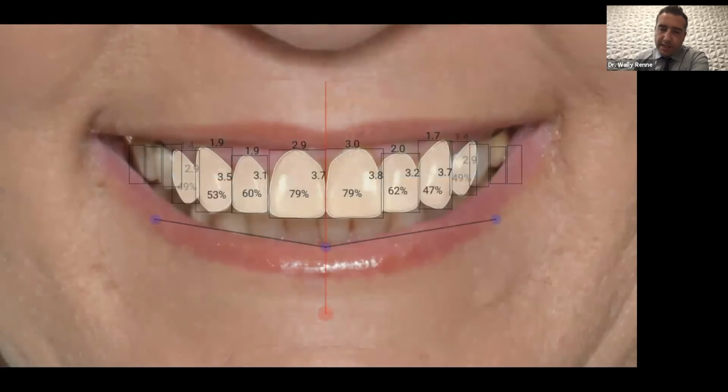And I like that they don't look ultra realistic, because there's some smile design software that literally takes somebody else's mouth and puts it in another person's mouth. And it's so pretty, but I could never achieve that final aesthetic. So I like that this is almost just a smidge cartoony, because it's supposed to be just a simulation. And I actually like that.